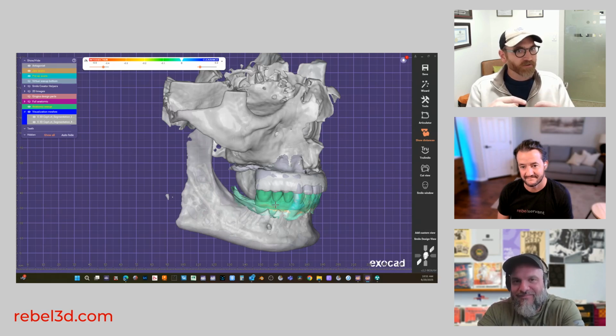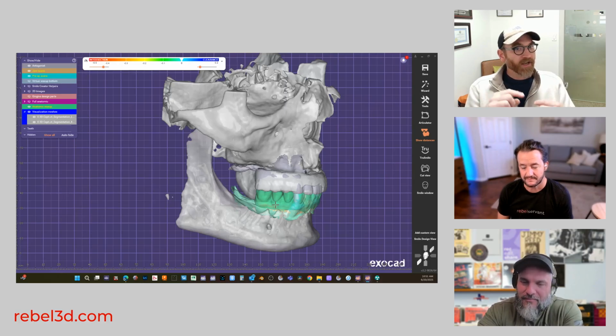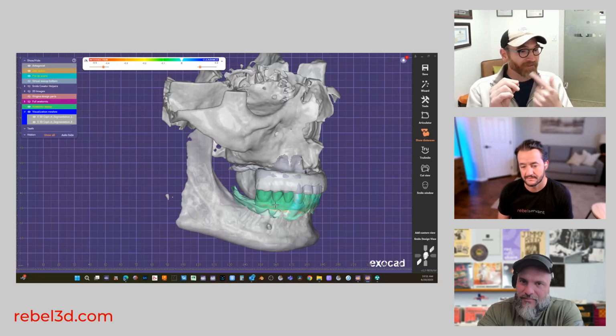I'll send you the videos, okay? And maybe you can include those in the podcast. And then what I did is, so I got him into MIP. So then I took it out. I did a 360 scan, because what did I not adjust? The bottom and the lingual, right? So I have that geometry preserved.